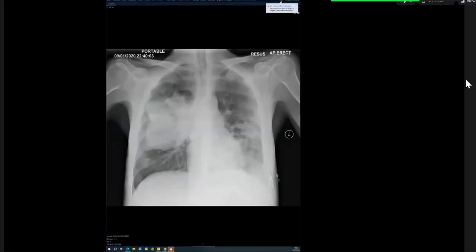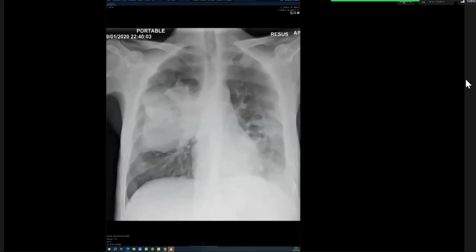Okay, have a go at this one. This patient is extremely unwell, let's just say that, as you can tell by the resus. Yes, I am presented with a plain X-ray of an unwell patient, skeletally mature.